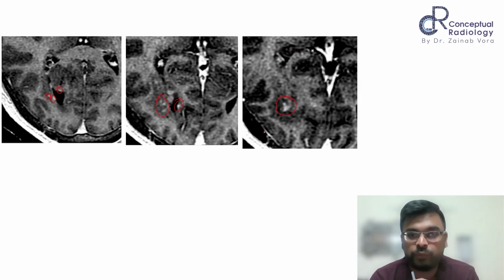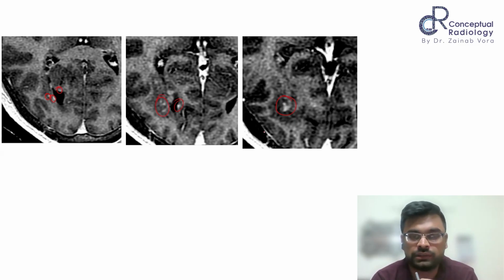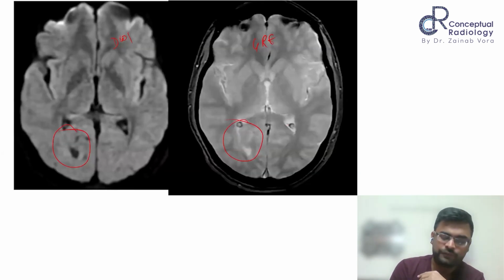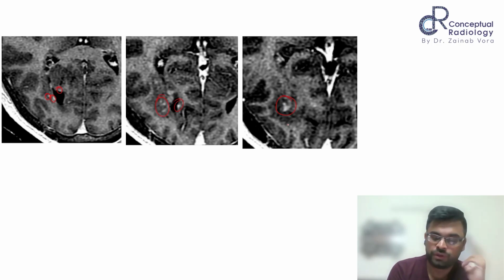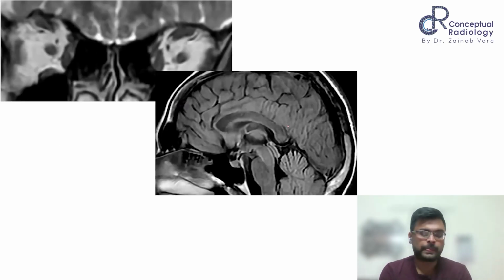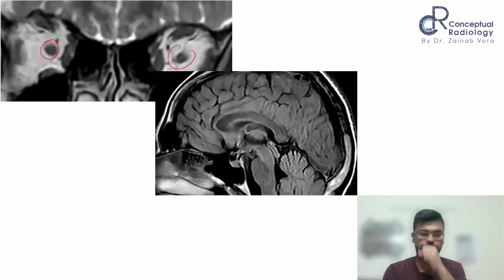So now, with more confidence, we can say that we are not dealing with a neoplastic etiology because we have intracranial lesions as well. We have cord lesions. In the cord, what we saw, there is involvement of the cervicomedullary junction. There is a thin rim of peripherally spared cord parenchyma that we discussed, right? And we also had a skip lesion. So all these findings are pointing towards a demyelinating etiology, and therefore we kept the possibility of NMO, longitudinally extensive lesion, right? Okay, so in this case, the optic nerves, they were normal.